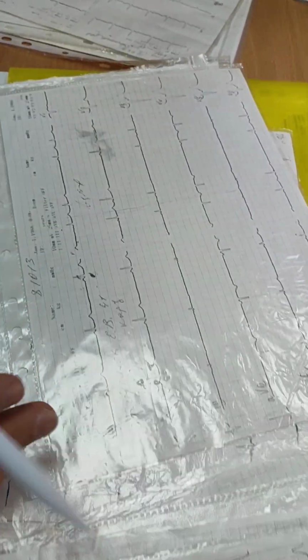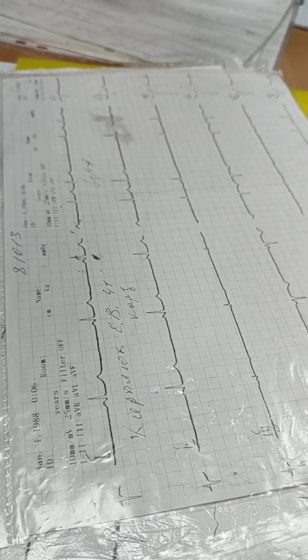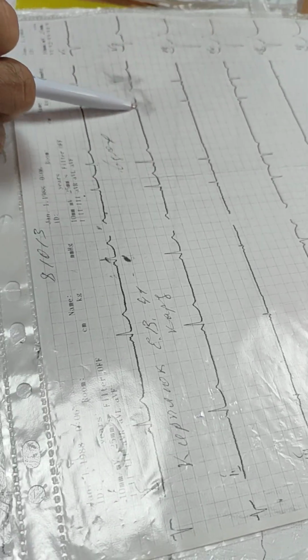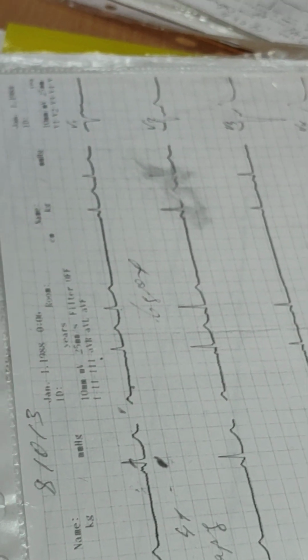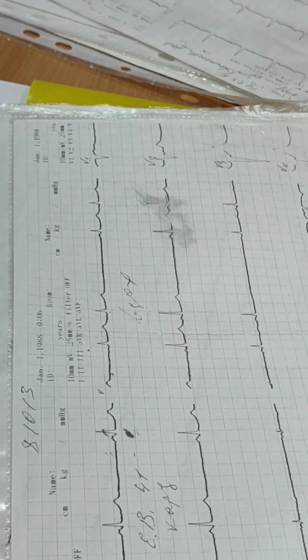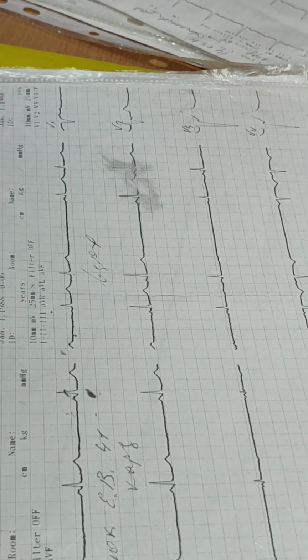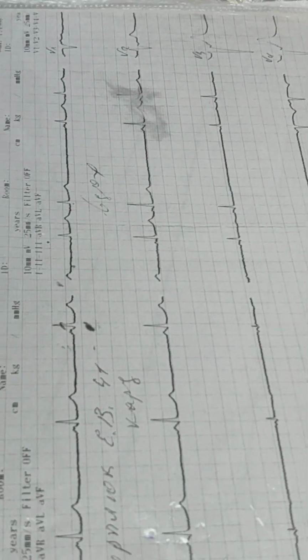This case, everything was okay. Next patient made inhale and stopped breathing. P waves are present and there is arrhythmia. This distance is shorter than normal one, but P waves are present. And this condition is constant. So, what is it?